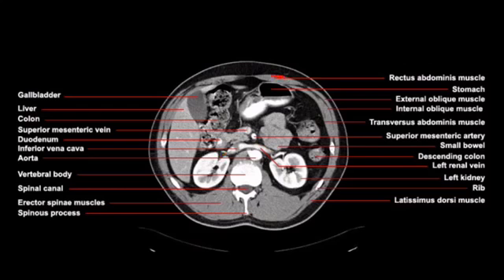We can still see a small portion of the contrast-filled stomach. Don't be confused. Notice that this bright part that's on the posterior side of the patient is simply the contrast in the stomach. The patient is laying on their back, and so we can see air in the anterior side of the stomach. We can still see those kidneys.